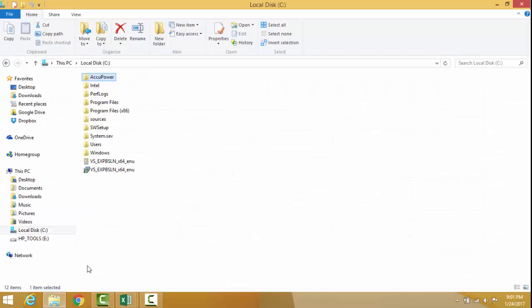Also saved with each trial are 6 intermediate files from each trial. These intermediate files are saved utilizing the same naming convention as the ACP files that you save. To ensure that these 6 data files are saved from each trial, be certain that the archive raw data is enabled in the settings menu. The reason for saving these intermediate files is if anything bad would happen to your data, or if you would need another measure of your data, you will have all the channel data stored.